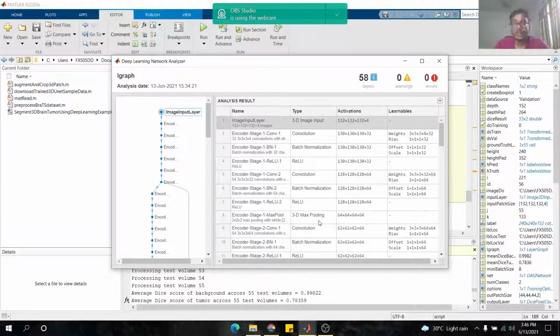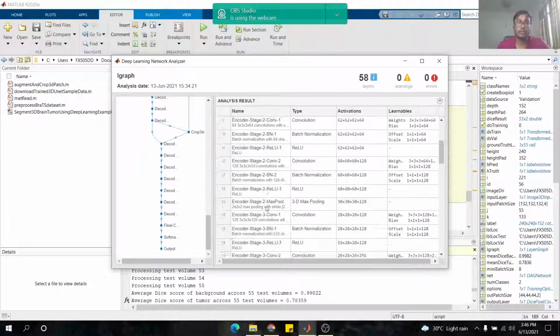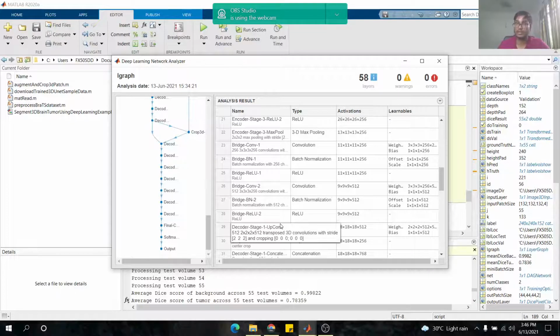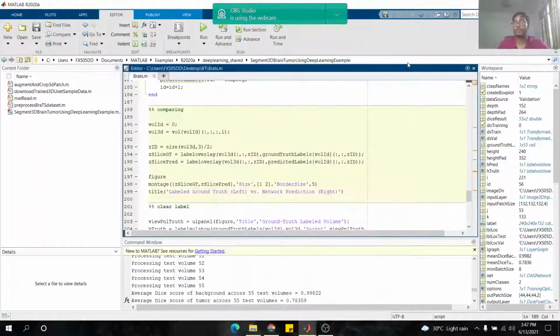Besides that, I also added two or three more extra ReLU layers, and one or two extra convolutions. But I replaced layers, so the number of layers is still the same, and I'd rather stick to these 58 layers because it matches very well with my CPU and GPU capacity. After running this, you will get a 3D structure, like a base on which it would work.